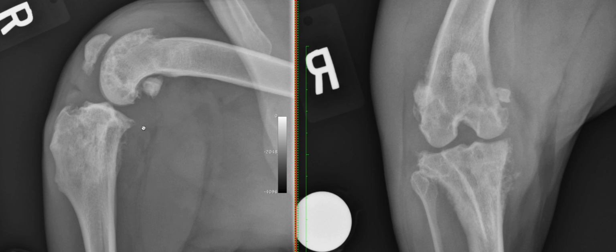The second feature is the presence of new bone production. Some of this new bone production is a bit smooth, like here on the distal aspect of the patella or here on the fibulae. But there is also some quite irregular new bone production here at the caudal aspect of the tibia, here definitely on this medial aspect of the tibia, and also a bit irregular, faint new bone at the level of the distal femur.